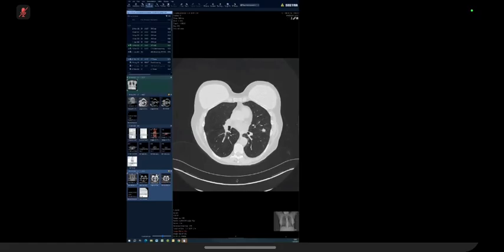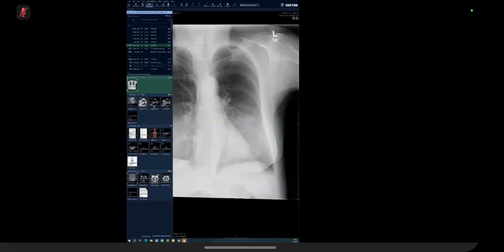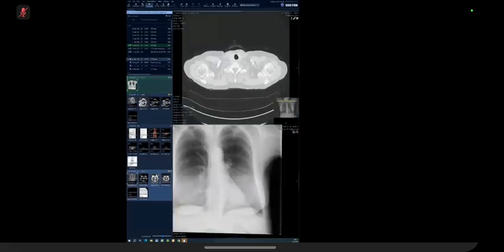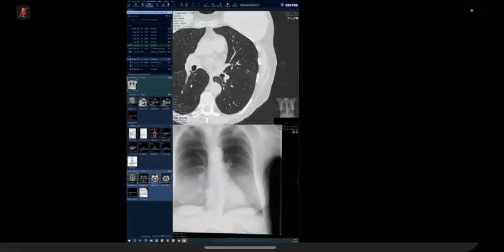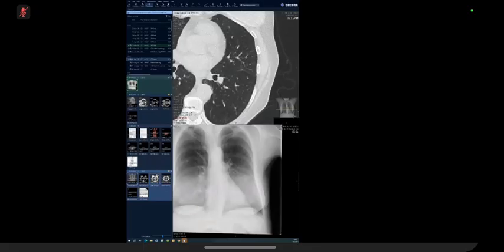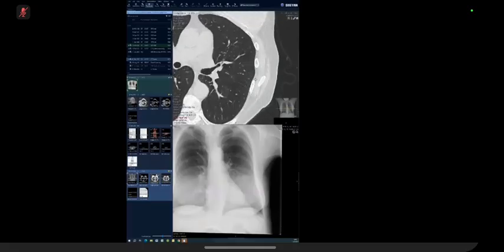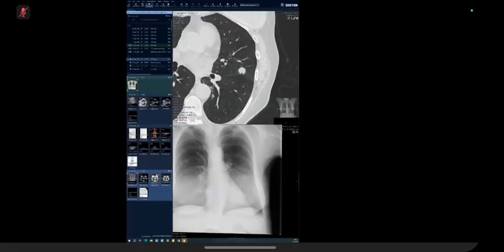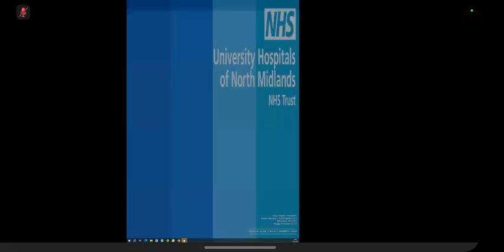And this, you didn't even see on this X-ray. Even if you go back, I still can't see it. So the bigger cancer was actually hidden. And here again, you said all the right things, but you didn't say them in order. And I think that was more nerves. So if you say solid nodule, spiculated margins, then you have to say what it is doing around it. You have to say tethering of the pleura, suggesting malignant pathology. Then you have to say no cavitation, no calcification, and so on. All of those things you did, but they went in a haphazard pattern. But I think this was a strong pass, this case.